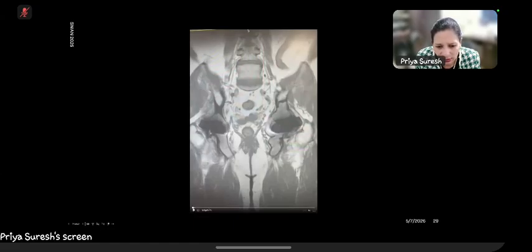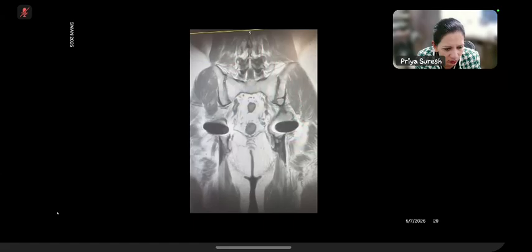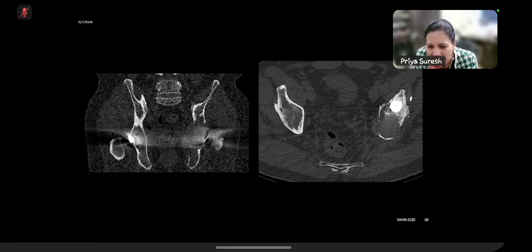So I think this is the same video, so we can go to the next slide. Yeah, so this is the CT scan on this patient. All the scanners nowadays are very clever, the technology is very good, and you can have a metal artifact reducing sequence, MARS, for the CT as well, and it really removes the artifact and can show it very nicely.